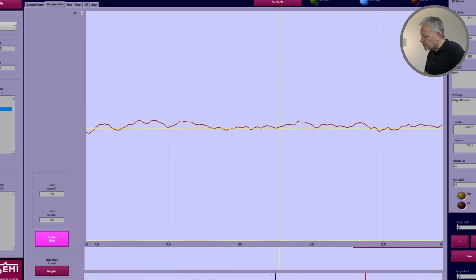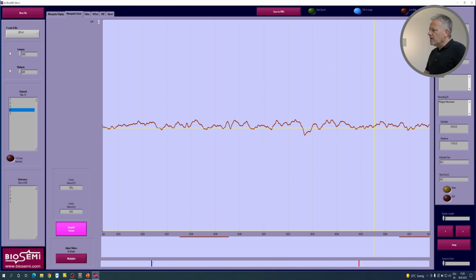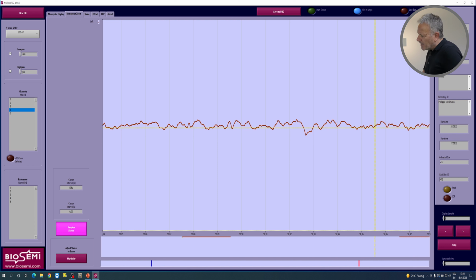Okay, so let's now look at how long the actual trigger was that we supplied. So we will bring one of the trigger markers back to about center. Now we have two levers here. We have two cursors. We have one cursor that we can move to the left and one cursor we can move to the right. Now obviously if they're opposite, vice versa, we will see a negative interval, which here would be 7.99 milliseconds in the minus. So we know immediately this cursor is wrong.